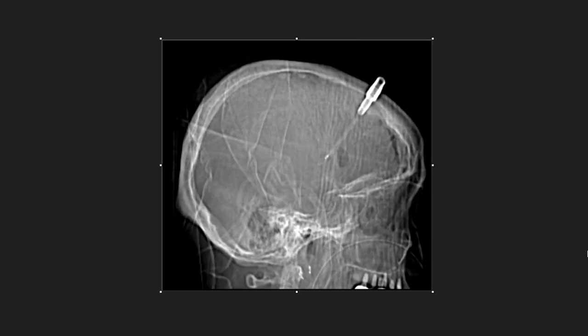So basically, let's say you're taking an exam and you're presented with a single image that you see here, and you might be posed with a question that might be something along the lines of what is the best explanation for the finding shown here? And I'll just give everyone a minute to look at it, and pause the video if you want. You can do whatever you want.